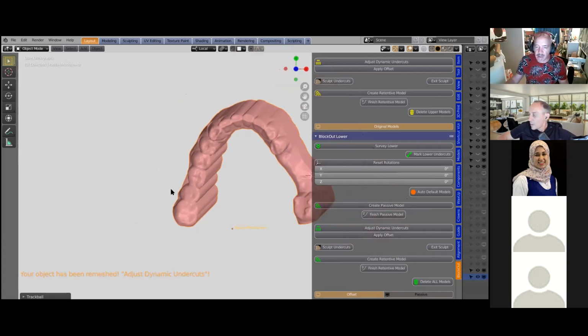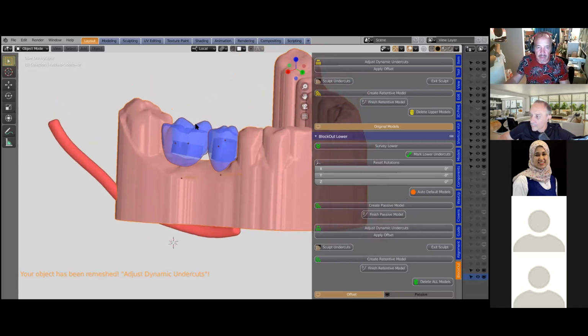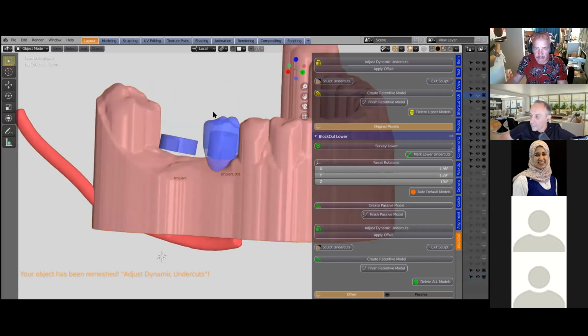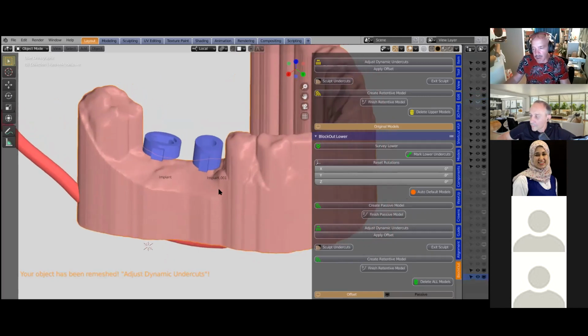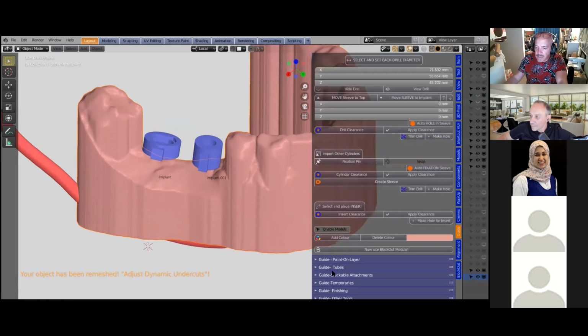Okay, so we're back here. We're back online, which is good. All right, so this becomes our target model. We're going to call this in the tube section.